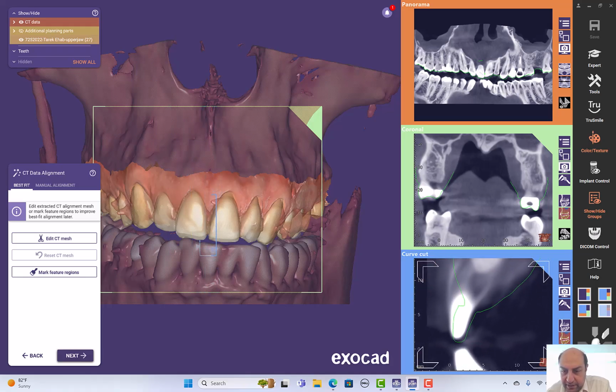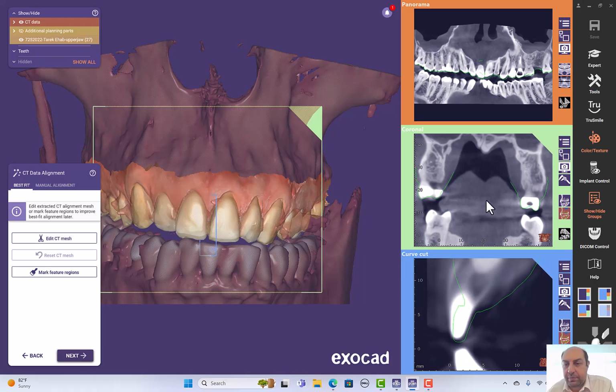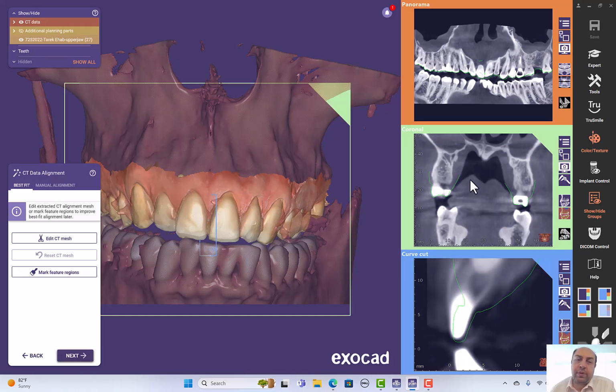for example, here, it's not a perfect match. As you can see, there is a small space. A small space in the registration means a small space in the implant position. And this will be a very big problem when in surgery you may perforate the bone and it may be a disaster for you and for the patient. You may need bone grafting, you may injure a vital structure. Take care for this exact specific registration step. It's very important.